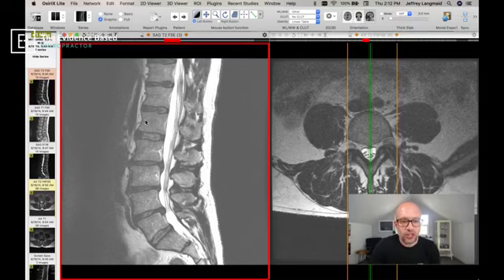As we look here, we can notice this segment, for instance, is very flat on the backside. That's great. This is quite flat as well. But when we get down here, you can see dark material has extended posteriorly or back towards where the nerves reside. And that is very valuable real estate. The amount of space where the spinal cord or the cauda equina go through is only at maximum about 10 millimeters in width or dimension. So even just 2 millimeters of a disc poking out, whether it's a bulge, a herniation, or an extrusion, takes up 20% of that space.